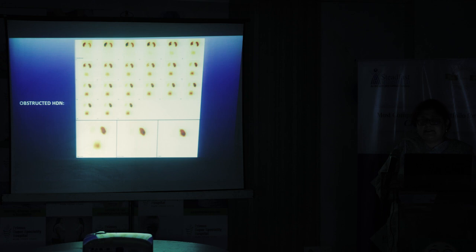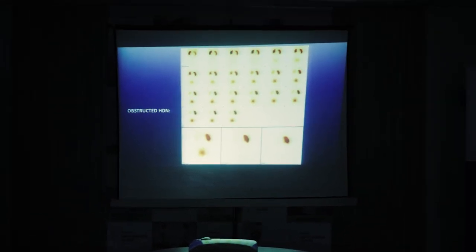So can somebody read this scan for me? Now you know how to read a scan. Anybody? So which is the right and which is the abnormal kidney? Let me tell you, let's start with that. Which do you think is the abnormal kidney, the right or the left? Right. Very good. Really? So what's happening here? Somebody read it.